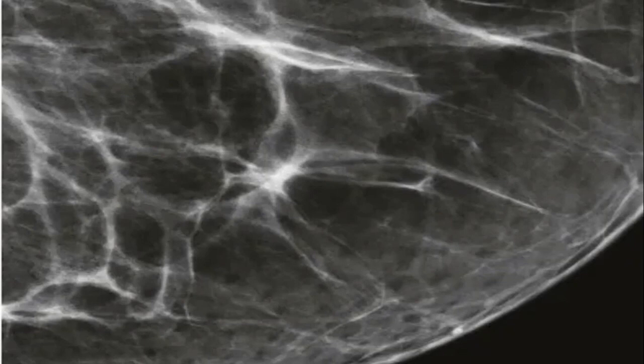Summation artifact, because we see here there is a little hyperdense lesion and the lines are crossing through it. Yes, they are not ending. You are right, 100%. The central area is hyperdense rather than a lucent area, and the lines pass through this questionable area, not pointing to that area.